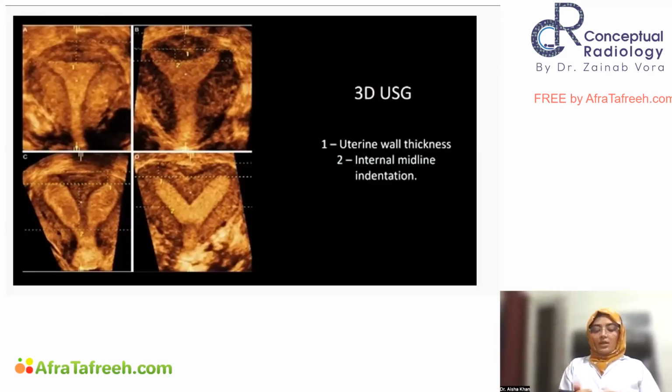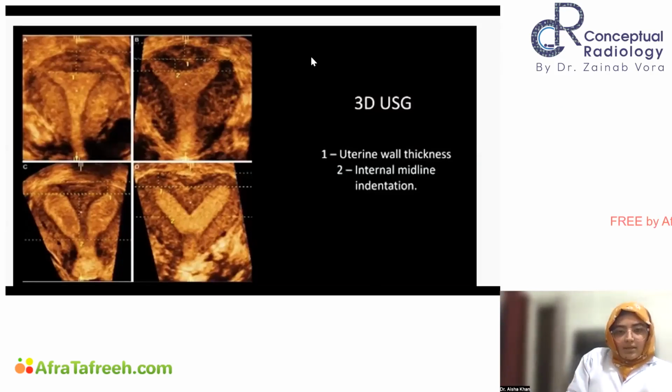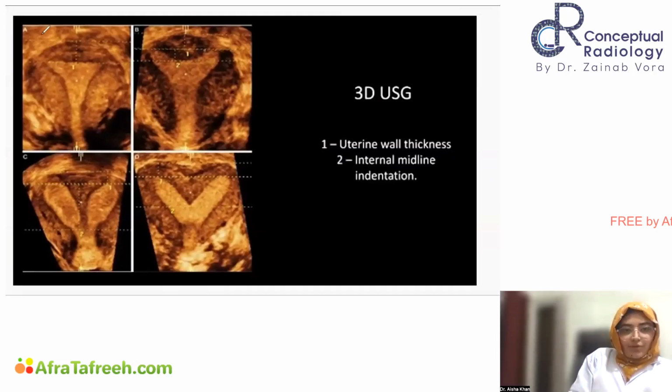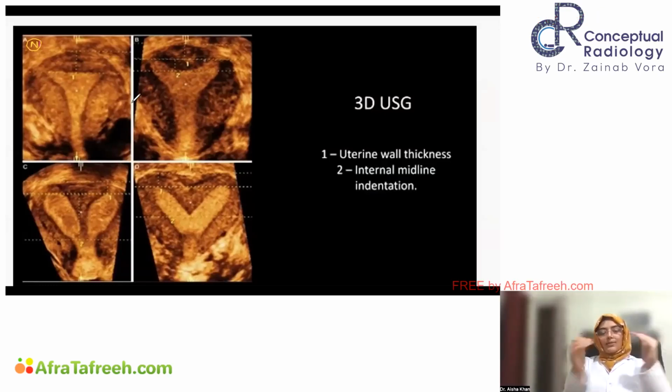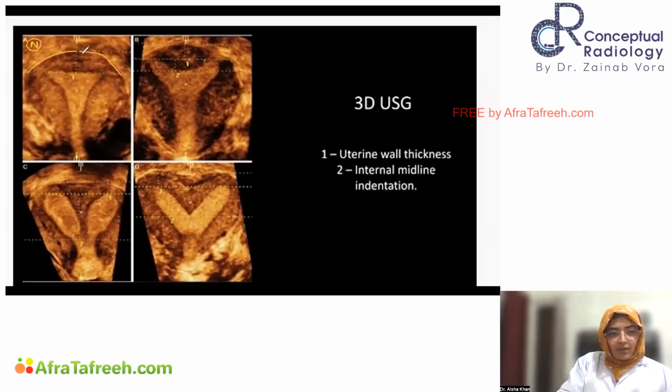Okay. Now I have to draw here, so let's try if it works. Yes, let's go. So first we look at this uterus. A image. Oh my god, this is the normal uterus. A image is the normal uterus. So in this you have to look at something external. What is external? External is a fundus. Sorry. So this is my fundus. It is appearing very beautifully convex.